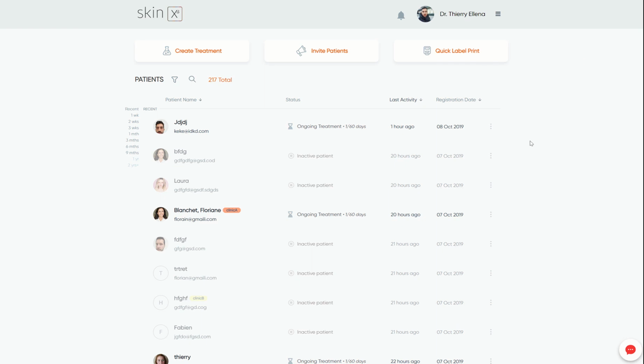Hello, it's me again. So in the previous video, I showed you how to play with the new Skinxs2, the new layout, how to create a treatment from a questionnaire, and how to play with the patient card and all the different options that we have inside the patient view. Also how to filter your patient list here. In this video, I'm going to talk about something more exciting, the create treatment.